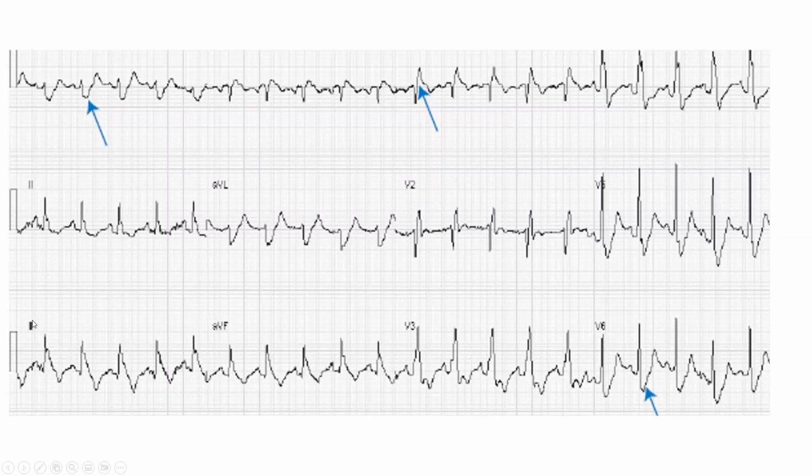So look at this EKG and tell me here what's the diagnosis. This is wide. This is very wide. It is 120 and more than 120. When we measure the QRS width, always pick the lead where it's widest. You can see in V5, V6, that QRS is quite wide. So it is complete right bundle branch block.